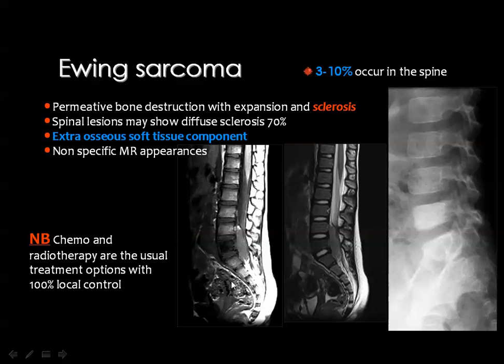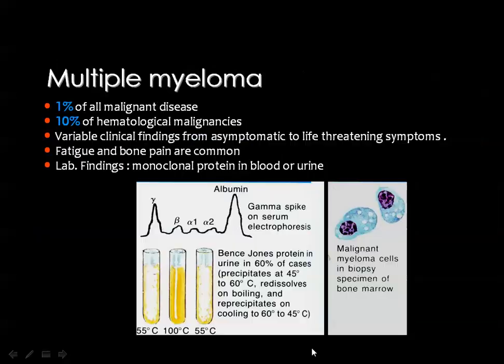And in MRI, you can see the vertebra is black in the T1 weighted image and also in the T2 weighted image. There is a soft tissue component anterior to the affected vertebra as well as posterior to it, infiltrating the spinal canal. Then you know that this is a malignant lesion, and in a child you may think of Ewing sarcoma. If you see a lesion like this in an adult, you should think of metastasis, and the best way for further evaluation is needle biopsy.